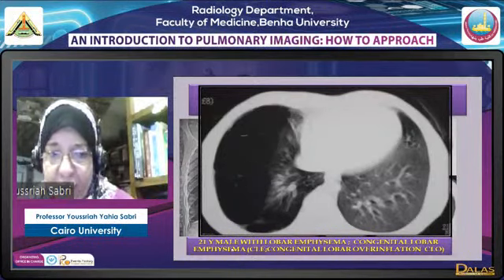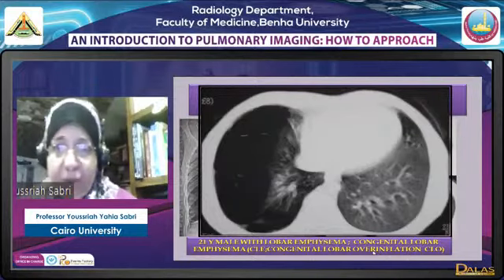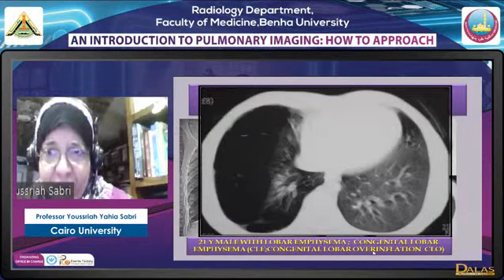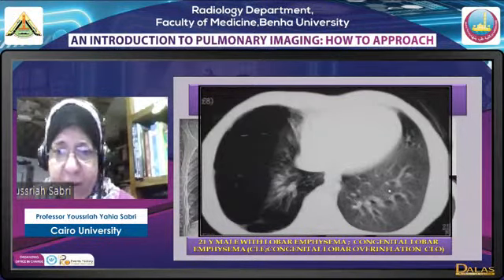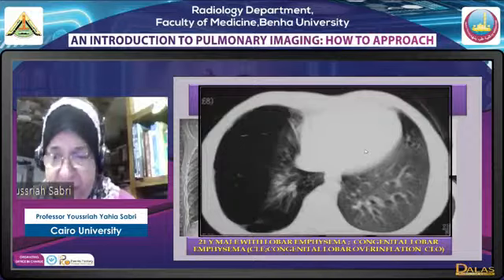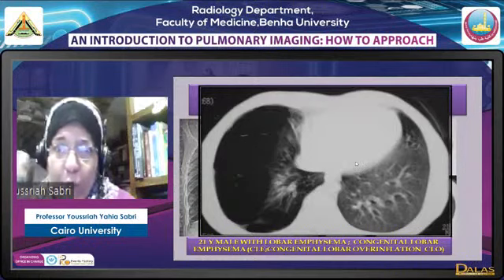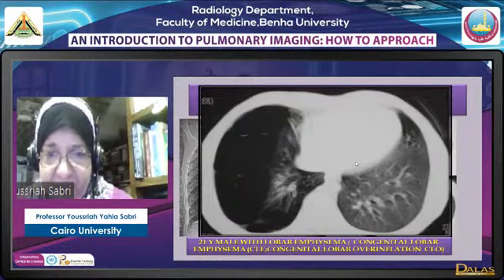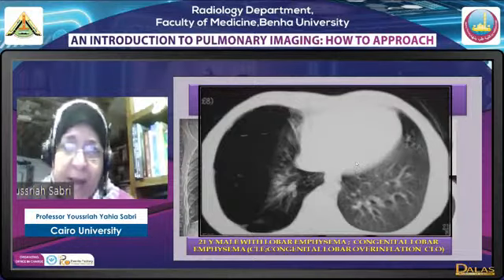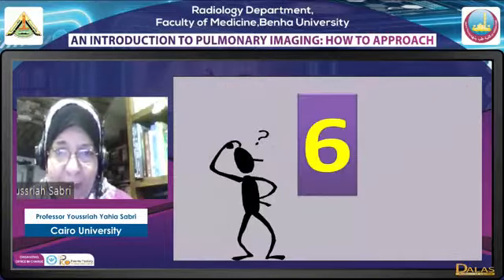And this was a 21-year-old patient with lobar emphysema. This is congenital lobar emphysema. Actually, this was the preoperative film of the patient before the lobe was removed. He came to us later, but I have made a copy of this study. So this is congenital lobar emphysema. We have only one lobe markedly emphysematous, obstructive emphysema. It's a congenital cause. The presence of the other lobes sort of balances the lesion.